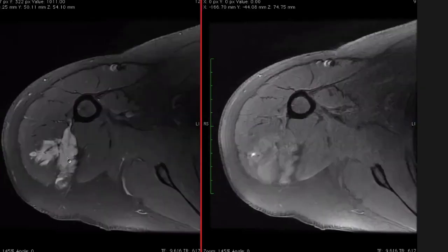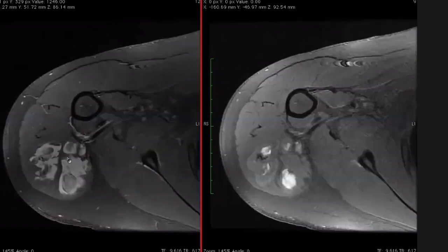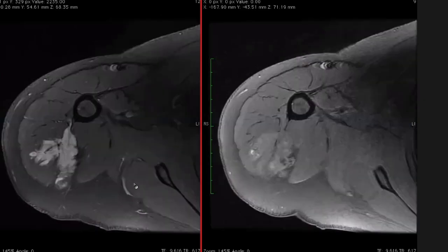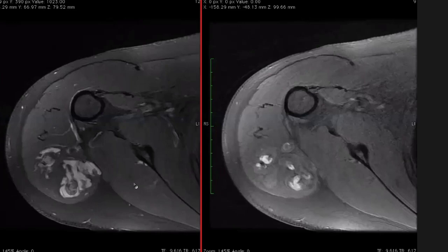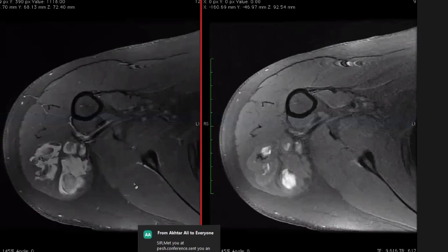And how would we know that this is filling? Is there any other imaging modality that we can use to diagnose these venous malformations, Dr. Aslam? Yes, sir. In other areas, for AVM, we go for angiograms, digital subtraction, MR, CT. I'm talking about non-invasive. Non-invasive ultrasound. Excellent. Ultrasound, exactly. So ultrasound is key in diagnosing these, right?